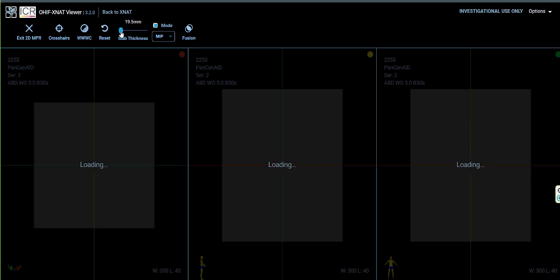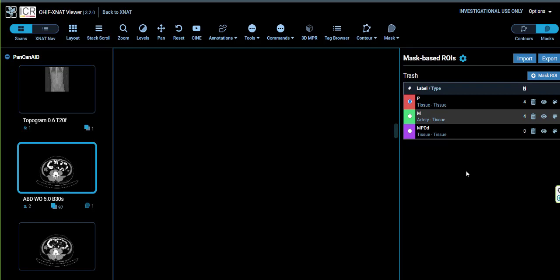It is also hard to actually change these 7.9 millimeters. You can also fuse some of these images. I will not use that because it really makes a heavy burden on the server. It usually takes 30 seconds for my server with 22 cores to run the 3D MPR. But since my server is currently doing some other tasks, it is busy, and you can already see that it can't actually do it. So these are the whole capabilities of XNAT.